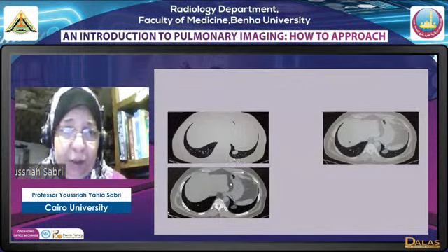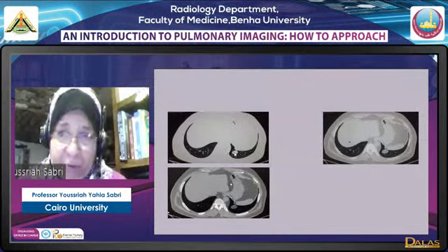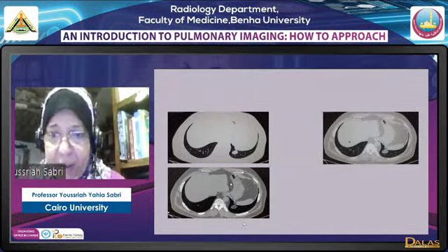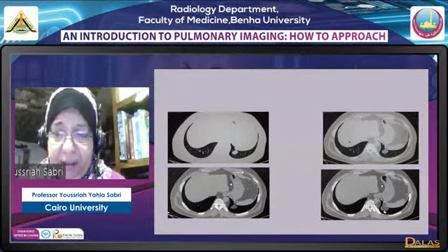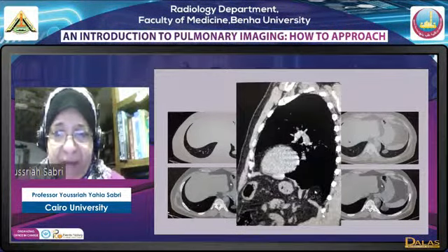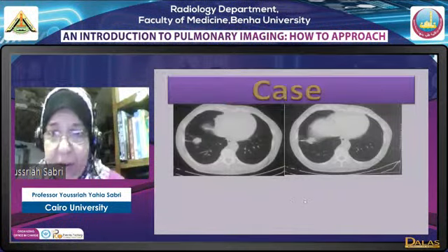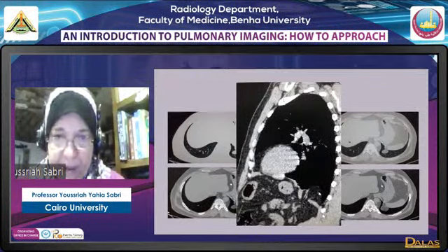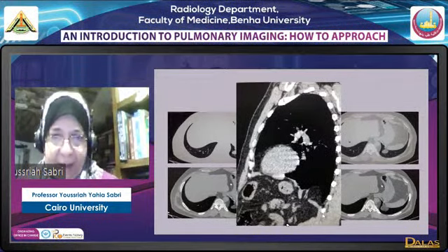So here we have a very suspicious lesion of single pulmonary nodule. Shifting between the lung window and the mediastinal window, what we had is an appearance suggestive of fat. Going through the mediastinal window, there was a suggestion that there is a perforation, or an opening, in the diaphragm, a defect. Reconstruction images showed that we actually have a defect in the diaphragm, and this was nothing but a small diaphragmatic hernia with fat, a Bochdalek hernia.